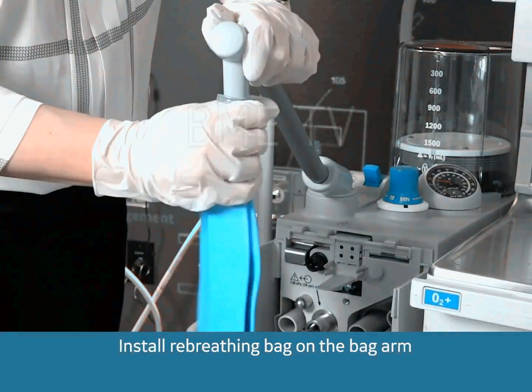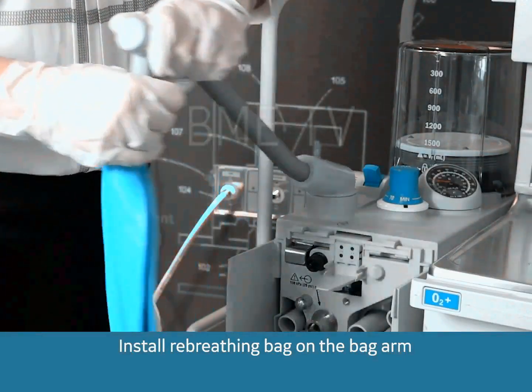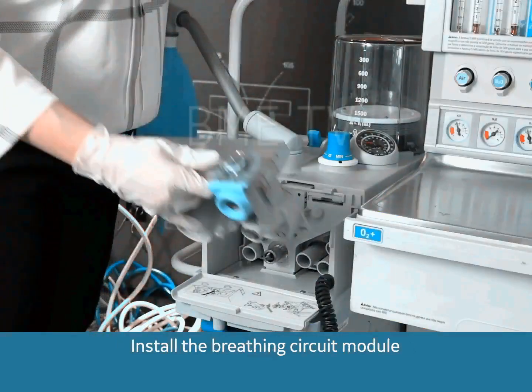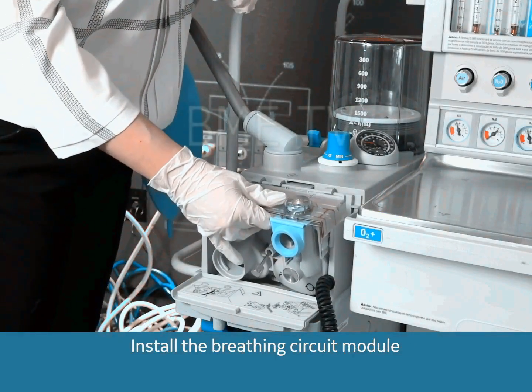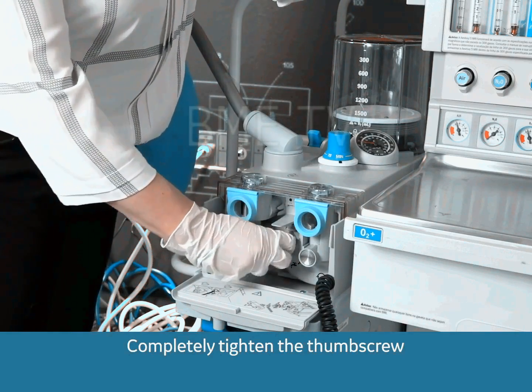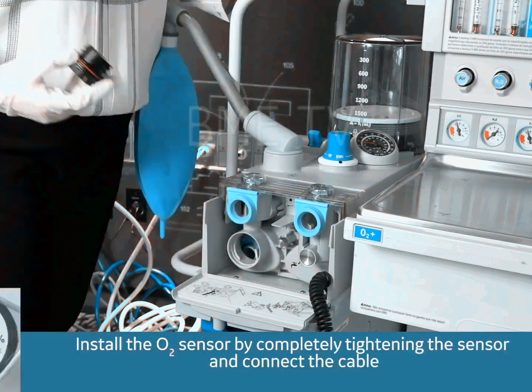Second is the reservoir bag. It allows collection of fresh gas flow during expiration, which in turn minimizes the amount of fresh gas required to prevent rebreathing. In addition, it allows the anesthetist to monitor the breathing pattern of a spontaneously breathing patient. These are usually plastic or rubber and can come in sizes between 0.5 liters to 6 liters. However, the most common size in the adult system is 2 liters.